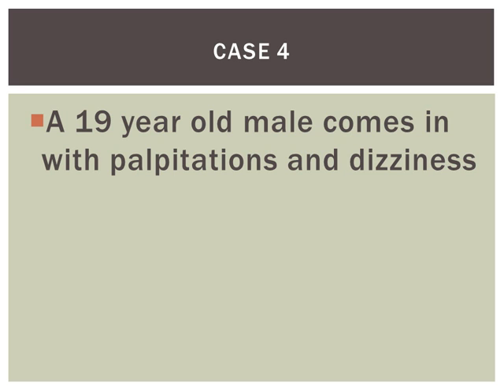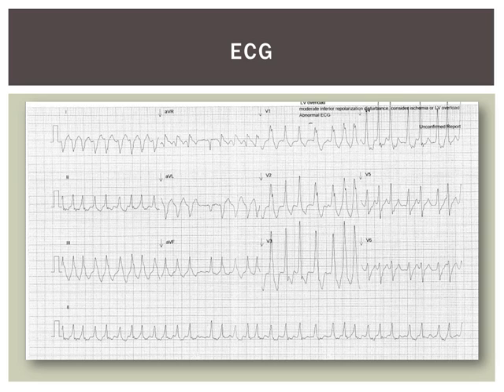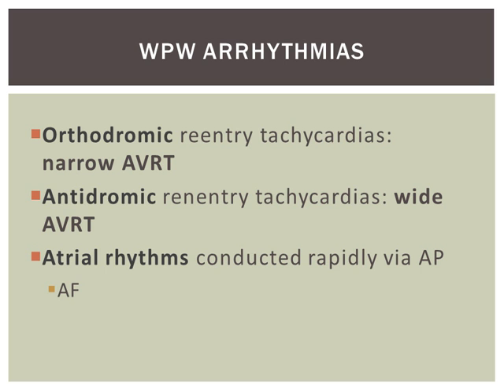A 19-year-old man comes in with palpitations and dizziness, and this is his ECG. Now, this is a bit more chaotic looking than the ones we've seen so far. What we've got is an irregular rhythm that's broad complex. But importantly, within the broad complex, there's a significant morphology variation. It's almost like every beat is different. So this is Wolff-Parkinson-White and pre-excited atrial fibrillation.